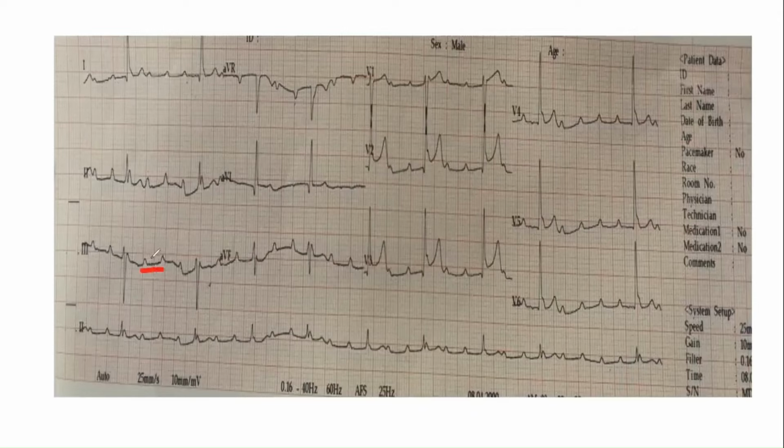So it's around 160, 170, which means the sinus is firing at 160, 170. It will not be that fast, though. So this was an atrial tachycardia with a functional block. And you see, this was conducting better here. It was a very, very long pause, and then again it improved. And so it was not a complete dissociation.